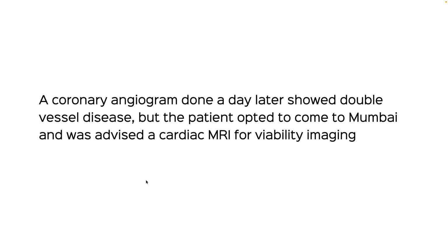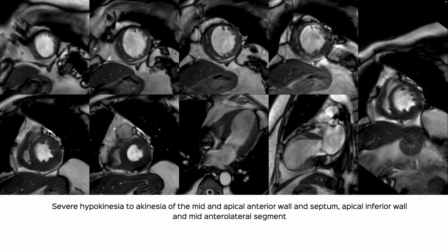A coronary angiogram had been done the day after the episode. It showed double vessel disease, LAD and circumflex, but the patient opted to come to Mumbai, so there was no immediate decision taken for revascularization. So then the patient became a candidate for cardiac MR.